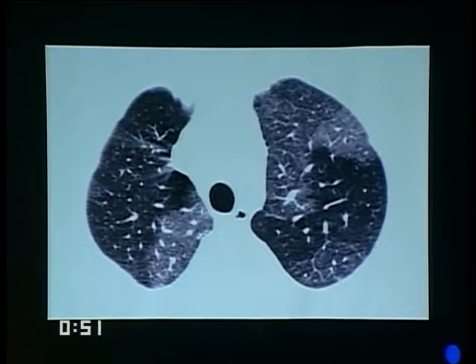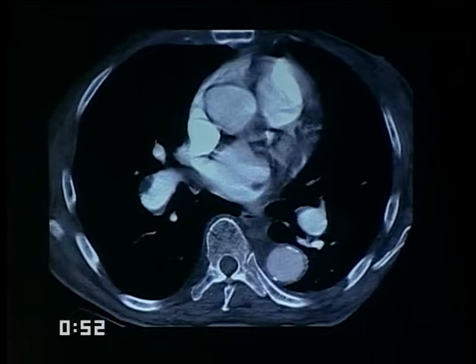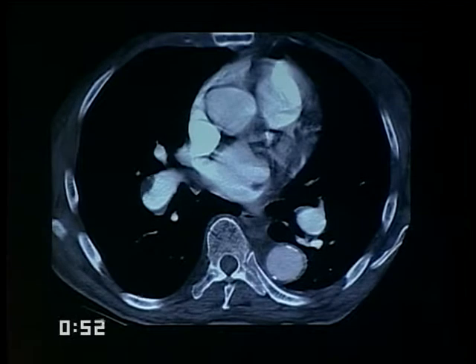And in the upper lobes with narrow windowing, we can appreciate that there's a degree of mosaic perfusion, also a sign described in chronic pulmonary embolism. Decreased perfusion in these areas relative to the more opacified areas of the lung. Again, mural thrombus, stuck to the wall, recanalization, very typical of chronic thrombus rather than acute embolus.